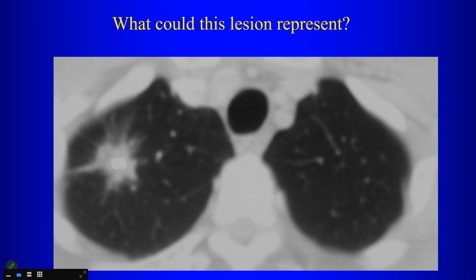Central calcification. Well, what could the calcification indicate? Granuloma with transformation? Well, granulomas don't transform into cancer. You can have dystrophic calcifications within cancer, but cancers can occur next to granulomas, so-called scar carcinomas that can engulf granulomas. And the most common cell type of scar carcinoma is adenocarcinoma.